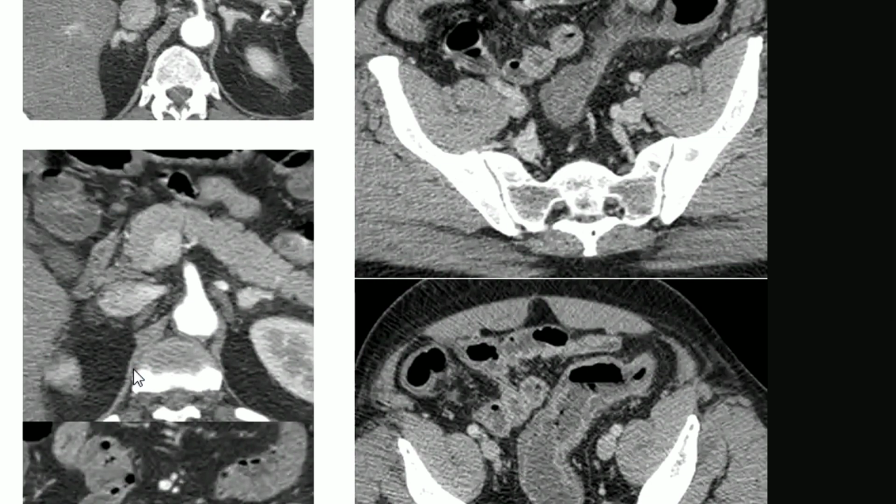Okay, well done. So you comment about the major branches of the aorta. Celiac and superior mesenteric arteries are patent. However, we have here thrombus at the inferior mesenteric artery. We don't see any contrast within it. And we have multiple calcified and non-calcified atheromatous plaques of the aorta and celiac trunk. The inferior mesenteric artery supplies the splenic flexure of the large bowel, descending colon, up to the upper two thirds of the rectum. So here this abnormality is at the level of the sigmoid colon.